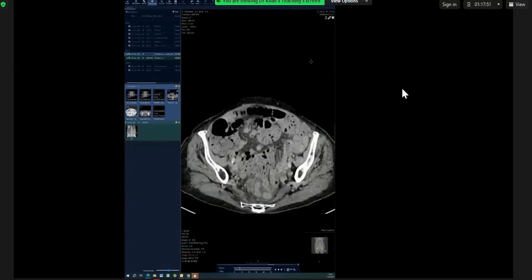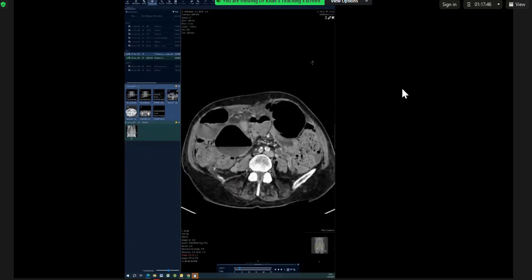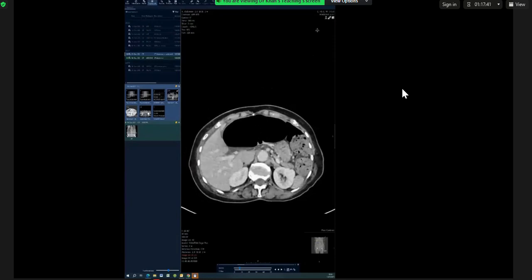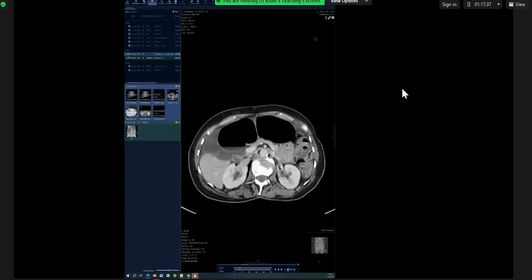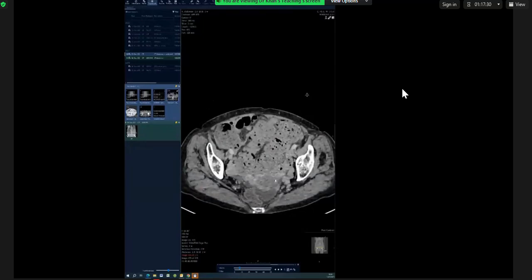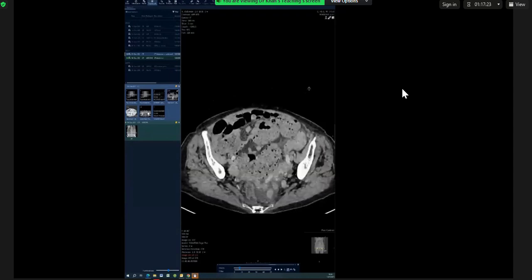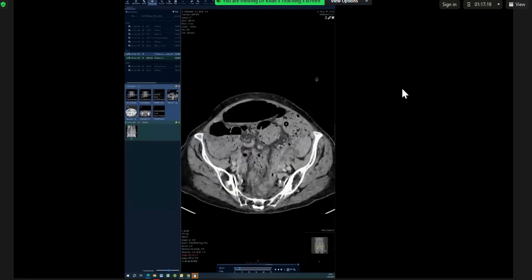You can see the distal bowel, again the left colon is here. I can see that there is interruption of the dilatation. There is an area of narrowing in the bowel. It's a little too rapid. Okay.